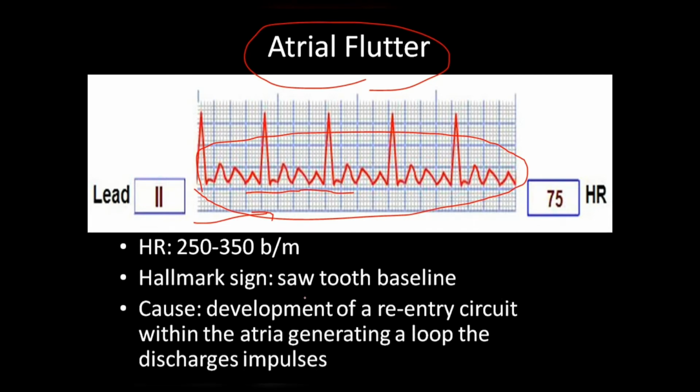The main cause for such waves is the development of a re-entry circuit within the atria, generating a loop that discharges impulses. So here a loop will be formed.